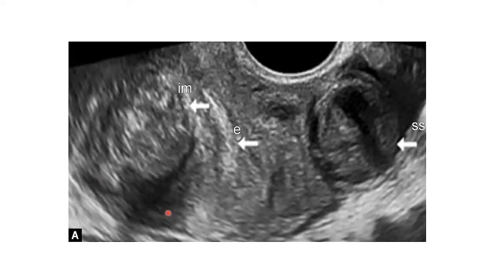So you must learn to appreciate and understand anatomy using different machines, because some machines have a very good resolution, but some don't have such good resolution. So you must be conversant using high-end machines and using the old machines, so that if you switch departments, you can still be competent in using these old machines.